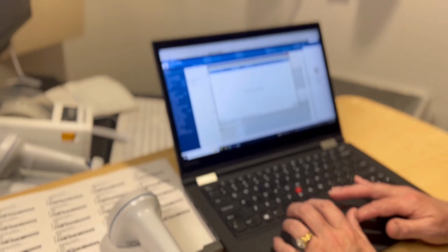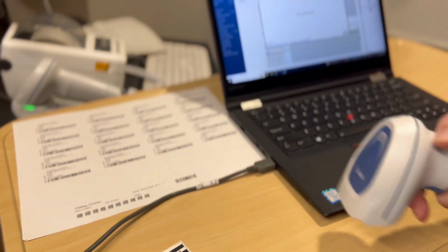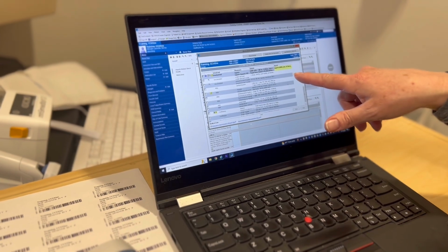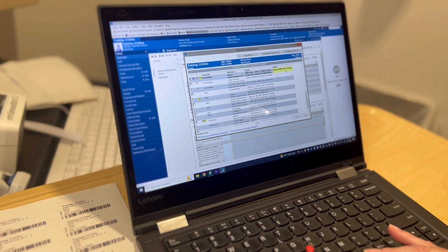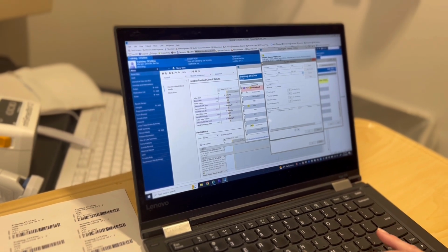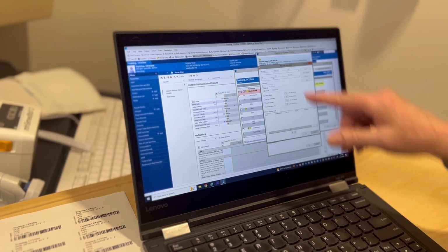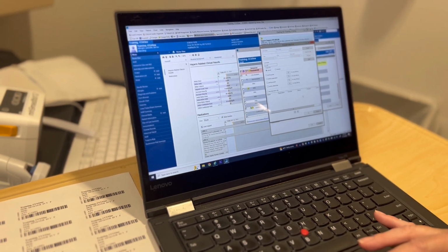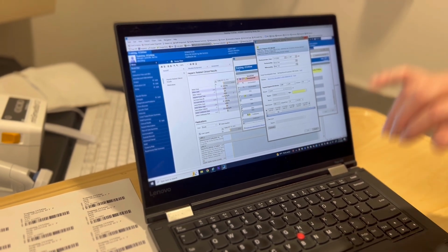So now I'm going to do the bolus. Once again, it shows up yellow, so I'm going to go in and click on it. Once again, I'm going to get a witness. You will search by last name. I have to, because we're in the train system, search by username. Take a look.